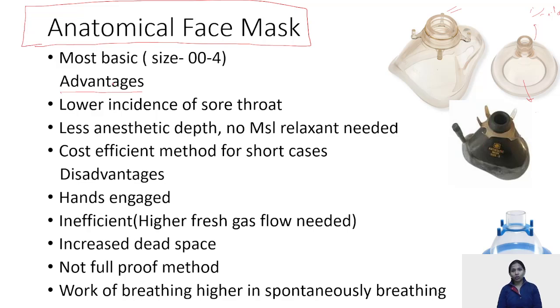If you remember from the CPR or the BLS class, these masks were used with head tilt, chin lift maneuvers, and with the help of the ambu bag or the breathing circuits, we can oxygenate the patient via these masks.